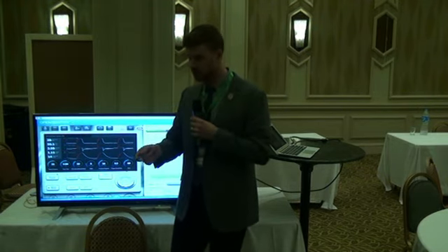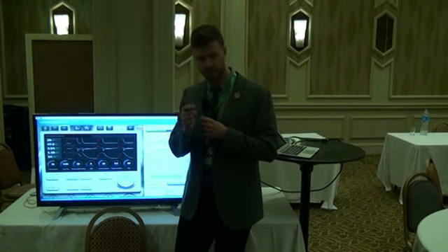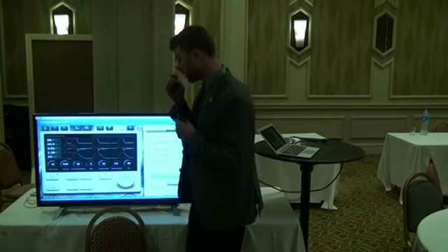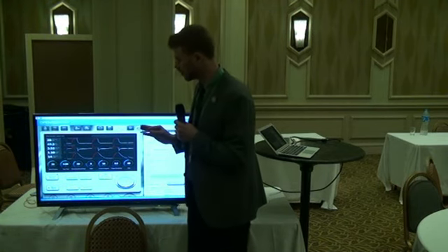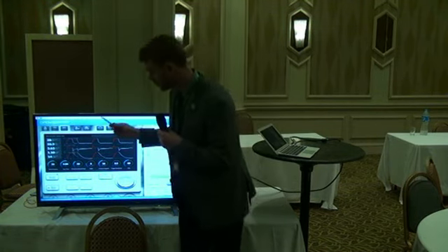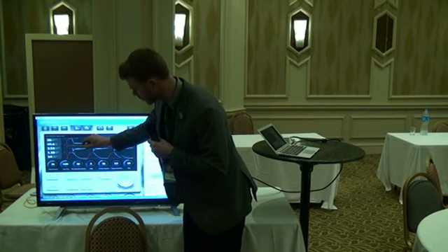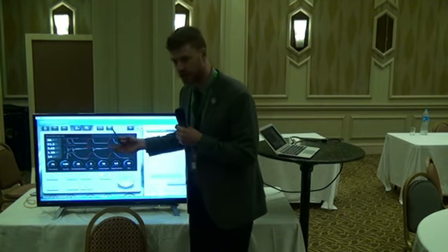Could maybe be secretions, constriction, other obstruction, could be a little bit of effort, maybe. So I think these are all good plans, and I think the principal thing, what's interesting, is you can kind of see that the inspiratory flow is a little bit noisy as well, but it's not as pronounced as during exhalation.